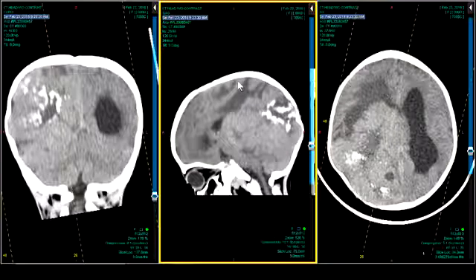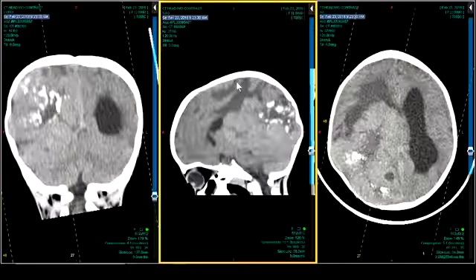Huge lesion, 4-year-old, intraaxial, calcified, aggressive looking. Yeah, some sort of embryonal cell thing, or, you know, I was wondering when I first saw it about atypical teratoid rhabdoid, although the patient's a little old for that. AT/RT, yeah. Fine. Usually that's kind of 2-year-old and below. So, you know, some sort of medullo or PNET or something like that, something very undifferentiated and aggressive.